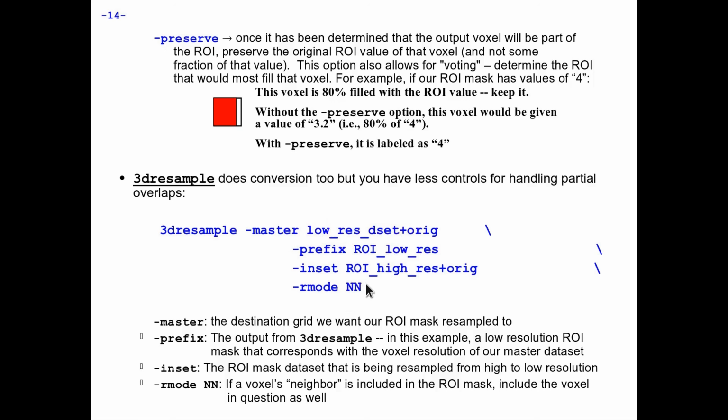So what does nearest neighbor mean? It doesn't average on the output. It finds the location in the original source data set that's closest to the voxel that we're moving our grid onto. So it will find the center of a voxel that's nearby. What's the closest center voxel from the original source data set?